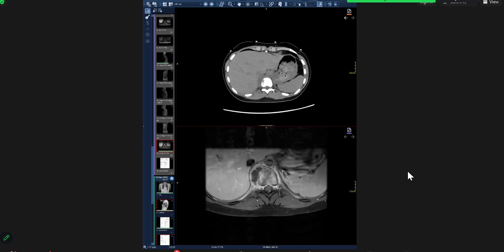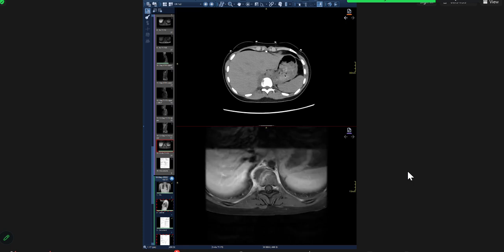You said that there was no intraspinal extension, but look at this. On MRI, there is evidence of it. So you have to be really, really careful. If a person has, for example, anything that is close to the spine, you are afraid of intraspinal extension, because that changes the management completely. If there is intraspinal extension of anything, be it cancer, a fluid collection or an abscess, then your management changes completely.